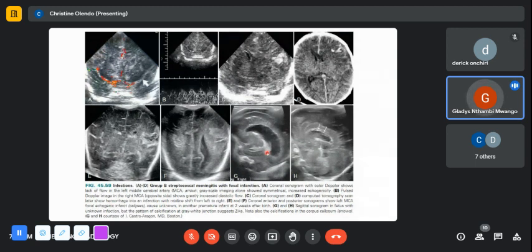They have sharp margins in E and F, the margins of the infarct, well defined, as opposed to the hemorrhage, which is more diffuse. So the calcification in G and H, they say it was because of Zika. So it's now added to the rest of the TORCH infections for causing calcifications.